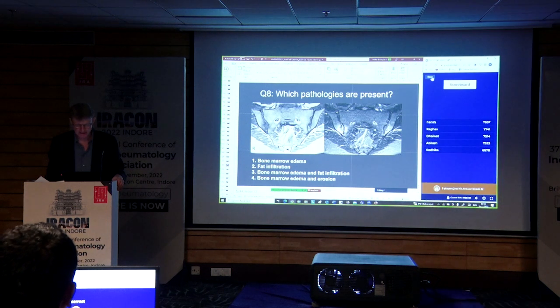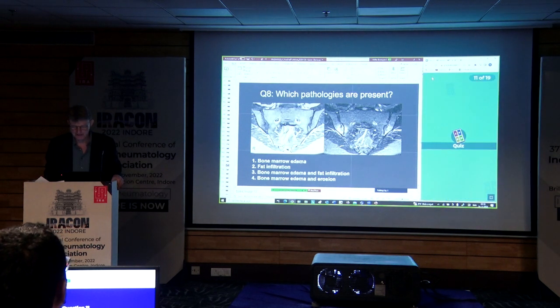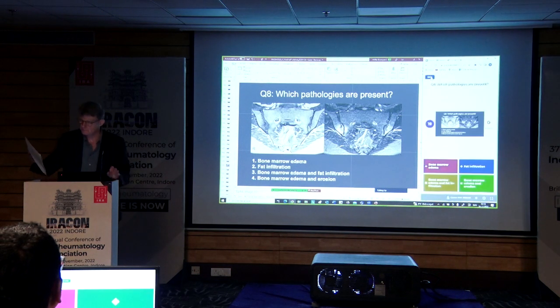Then the next case you can see on the screen right now, and you should answer the same type of questions as before. So what do you see here?